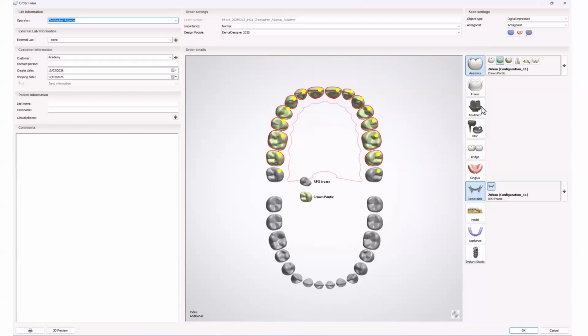So in here, it's also a good moment to mention the differences. When it comes to designing using the denture module, we will receive, let's say, a full contour gingiva and full contour teeth. Those will be generated as one file. So of course, staining and glazing it and adding some colors shouldn't be too much of a problem. One of the big advantages of the denture module is the gingiva tools. They are looking very nice and aesthetic. So that will give really good results during the design.